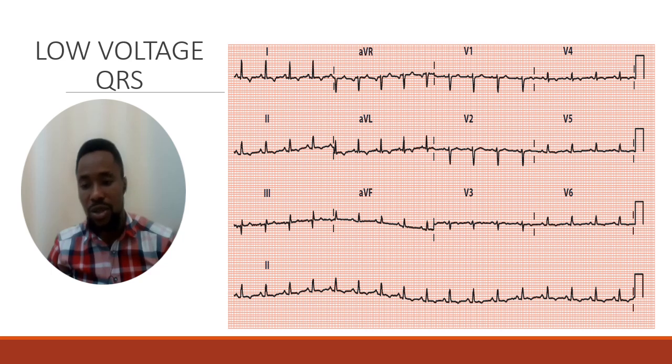If you don't see this sign, don't interpret the ECG. This shows that standardization means that the ECG has been calibrated to run at a particular speed. Look under the ECGs that you are reporting. When you say 25 millimeter per second, you go on with all these teachings I'm teaching. But if you see 50 millimeter per second, then you make some adjustments in your calculation.